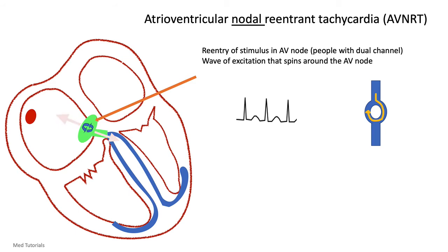So very often what happens is atrial depolarization is masked by the bigger ventricular depolarization. That's why the P wave might actually be hidden in the QRS and you won't see a P wave on the ECG. But sometimes the atrial depolarization may be a little delayed compared to ventricular depolarization, and there you might get a retrograde P wave.